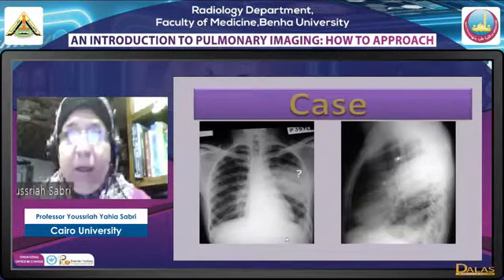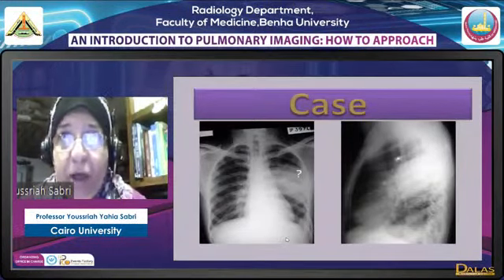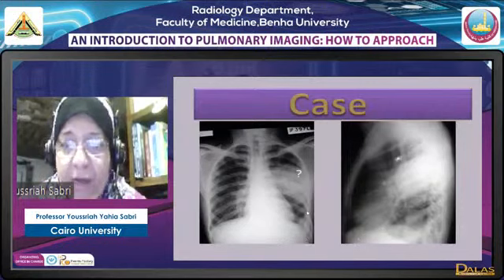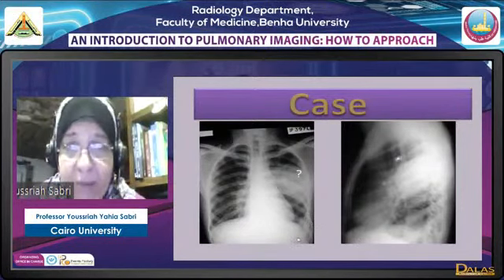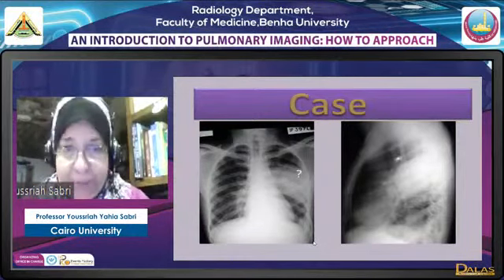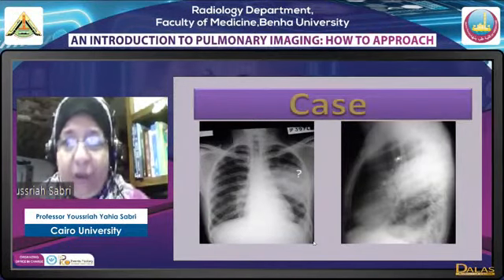These three points that we have just discussed: change in the configuration from PA to lateral, one ill-defined, one well-defined, number one. Number two, having a pleural relation, which is the major fissure here. Number three, an ipsilateral pleural lesion is also visible. These three findings suggest that we are dealing with a pleural lesion. Not the classic, of course, effusion and so on. This is a loculated effusion.